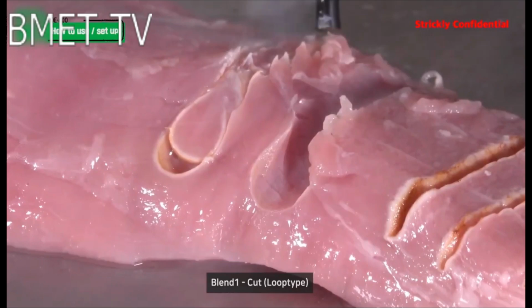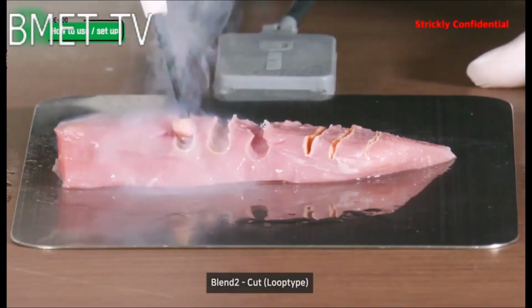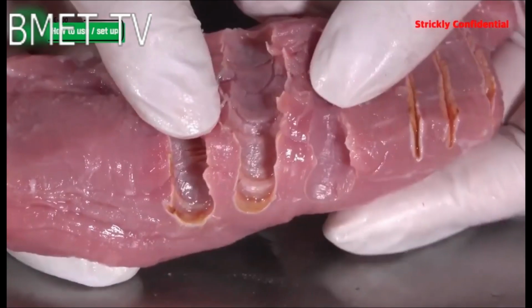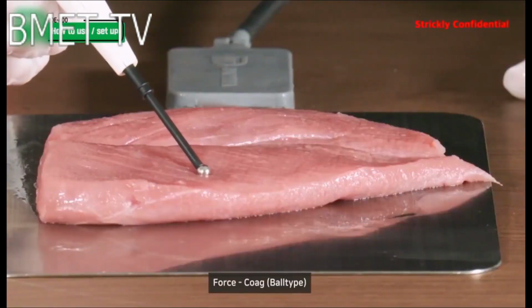is contraindicated. Additional modalities of electrosurgery include electrolysis, which uses a chemical reaction caused by a direct current to damage tissue, and coblation, used for facial rejuvenation, which uses an electrical current to ionize a conduction medium such as isotonic saline. The ionized medium is then used to transmit heat to tissue.